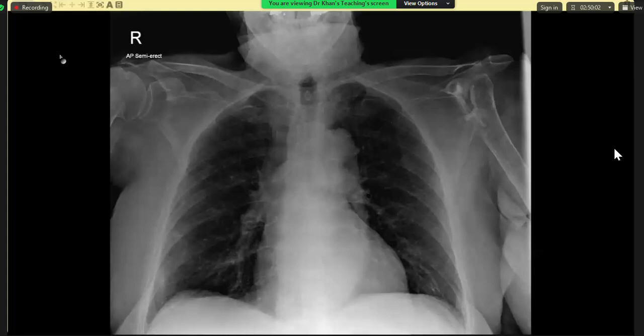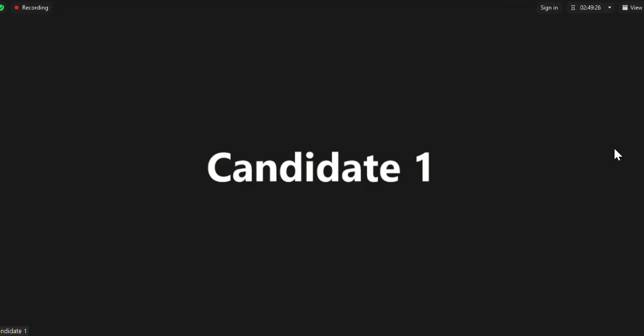The patient also has got multiple other joint pains. Sir, can I see the hand radiographs of the patient? So with this history, what comes to your mind? It can be bilateral advanced osteoarthritis or any other. Hemophilia is more likely to involve knees, so hemophilia is less likely a possibility. Rheumatoid arthritis normally involves the small joints more rather than shoulders.